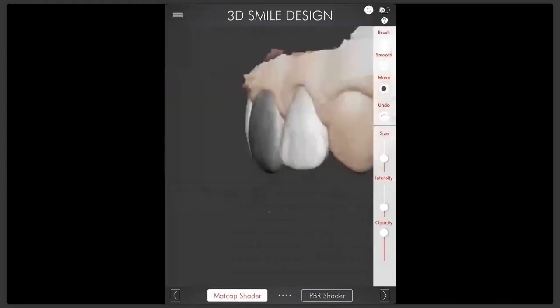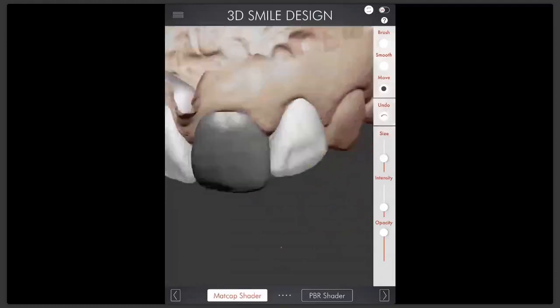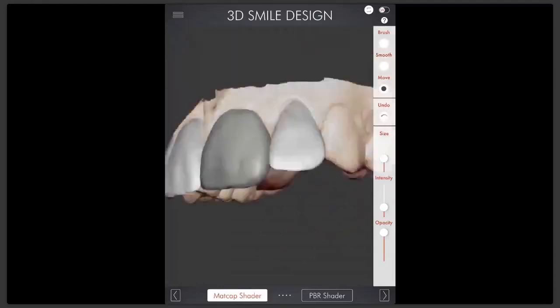The polygons are the 3D objects, right? Like how the 3D image is formed. So it doesn't distort them. Like I would say, the pixels, right? It's something for you to understand like that. So it doesn't distort. It just moves. It doesn't add, right? So I think it looks better.